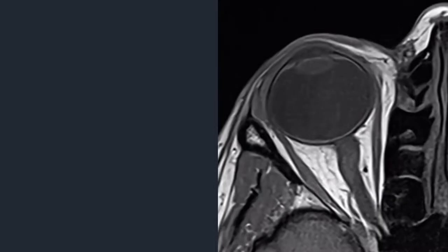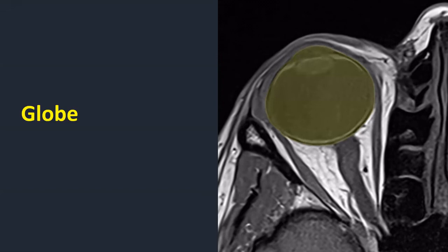This presentation will mostly be about MRI of the orbits, because despite the fact that the orbit, the small pyramid-shaped bony structure containing the globe of the eye and the other components of the eye, despite the fact that it's very small, it's very rich in anatomy, and there is a wide variety of pathology that can be encountered there. So as said, the orbits are basically pyramid-shaped or triangular-shaped bony structures housing the eye, providing protection to the eye.